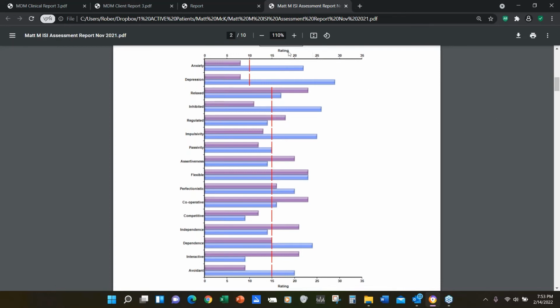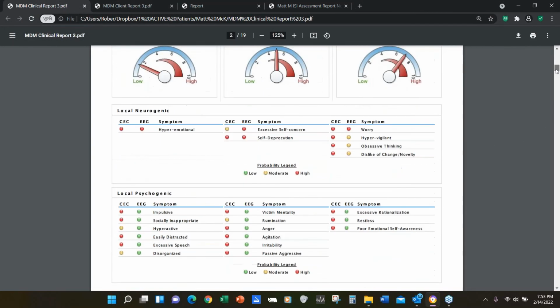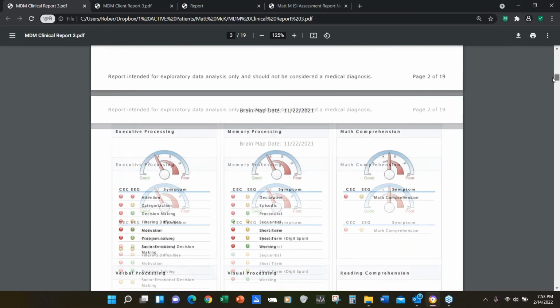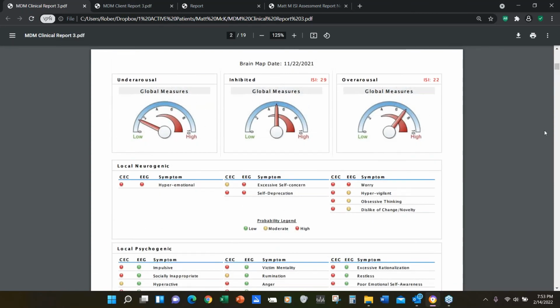So well said. Yeah, excellent. And in the dashboard, when verbal, or verbal and visual, is sitting so high, like at 8, that really lets you know you have to watch the amount of words you use. Right, and look at overarousal. An anxious person cannot take in this information. They would need to take a course for them to get it.